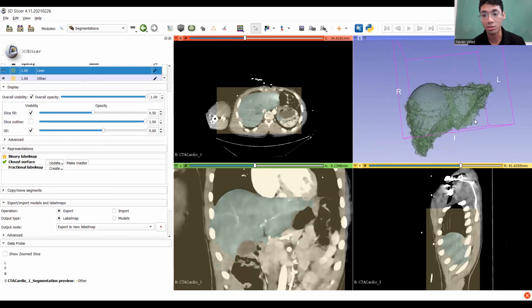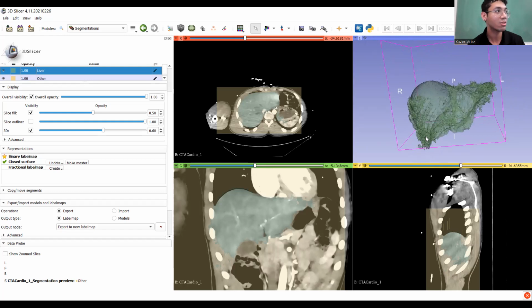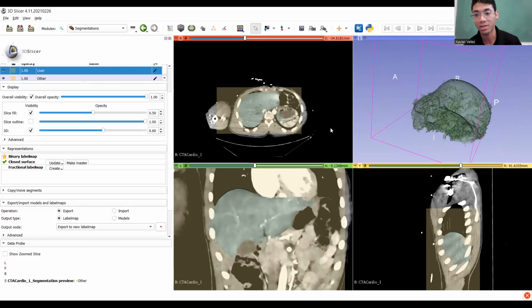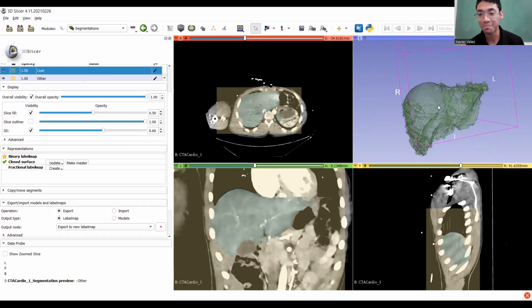And it is going to look terrible. It looks so bad. What is that? You're probably thinking, man, I thought I was doing a good job. This looks terrible. But don't worry, we're going to fix it. It's going to turn out better by the end of it.